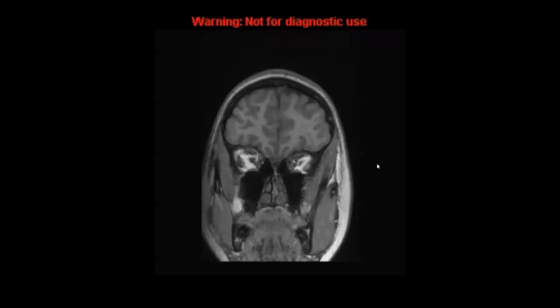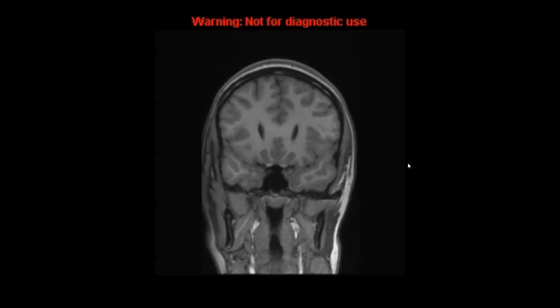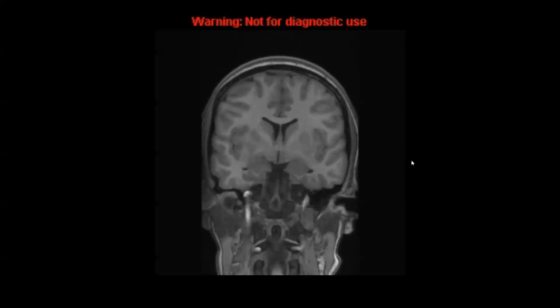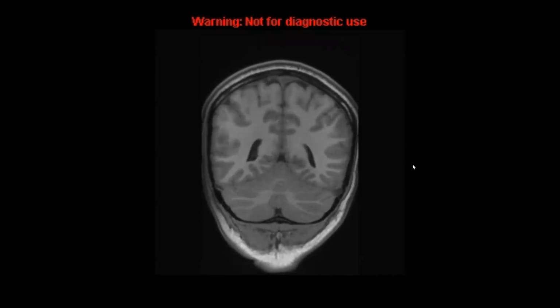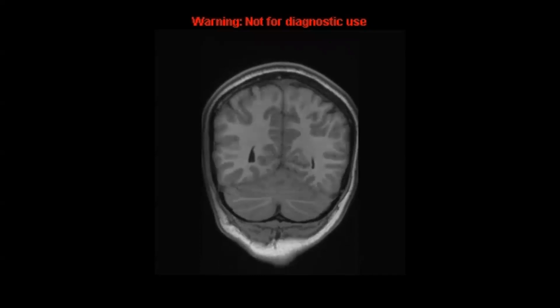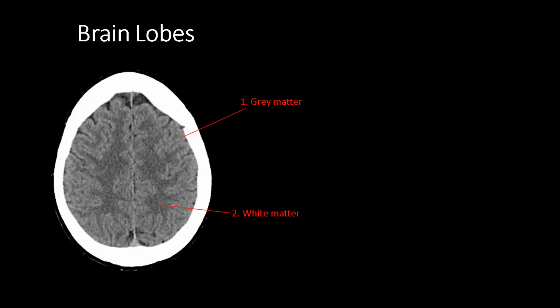Again, this is how it looks on an MRI. So here's the right orbit, here's the left orbit, and we would move posteriorly as we scroll through the brain. Really in radiology, when we are using these planes, for every case we look at, we're looking at all three planes in conjunction with each other to try and put together the findings and come to our diagnosis. But for the rest of today's talk, just to keep things reasonable in terms of the length of the video, we're just going to focus on the axial plane from here on out.